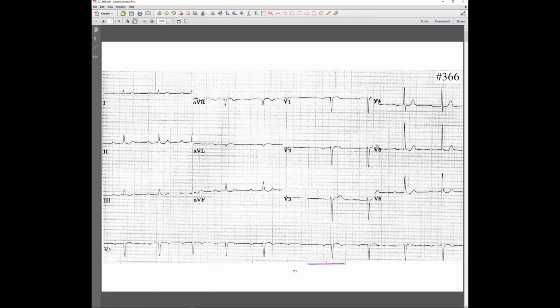So what is the heart rate? 50. What? How much? 50? Why? Because if you do have 6 beats in 6 seconds, in 60 seconds you have 10 times 6, so it's 60. But is there 5? Oh, okay. From here to this point, but you can measure the longer interval, so the rate is around 60.